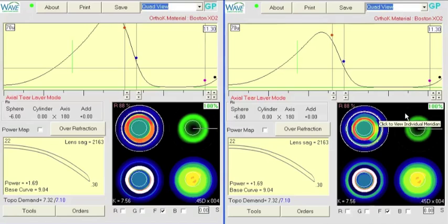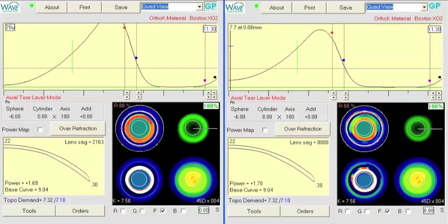So when we're steepening the periphery of the cornea, or the lens rather, what I like to do is aim for about a 4 to 5 micron change. And what I mean by that is here we have about 2.8 microns of central clearance. So at most, I want to end up with about 7.8 microns of clearance. So I'm just going to come to the IC and click down about 4 times. And that puts us at about 7.7, so right under 7.8, and I think it's pretty reasonable. I would not do more than that unless something very unusual were happening with the lens.